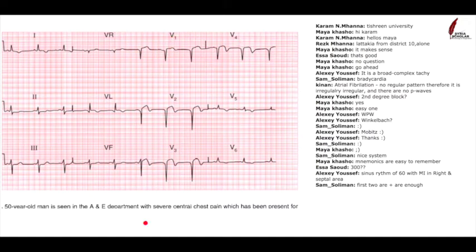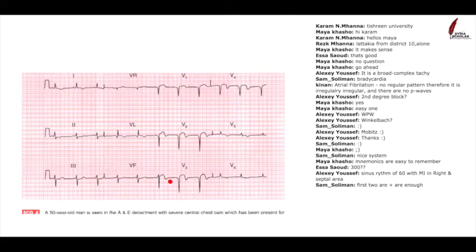So which areas are those? Which parts of the heart? Is it the inferior parts? The anterior parts? Or the left part? Where are we finding these Q waves?